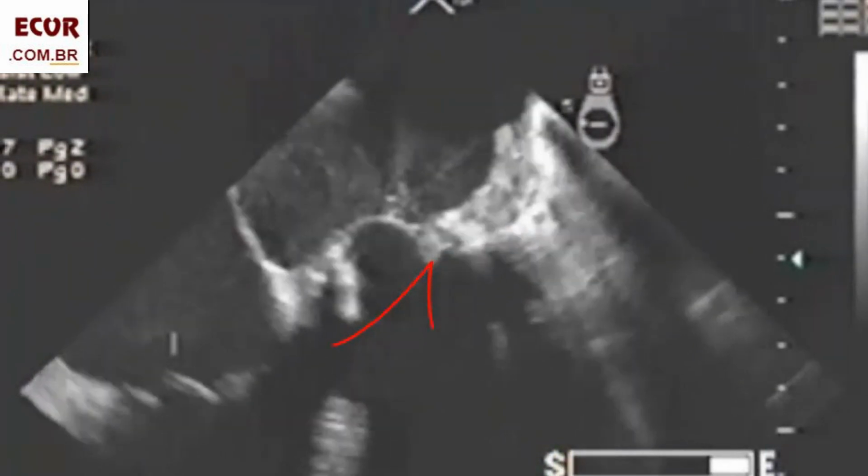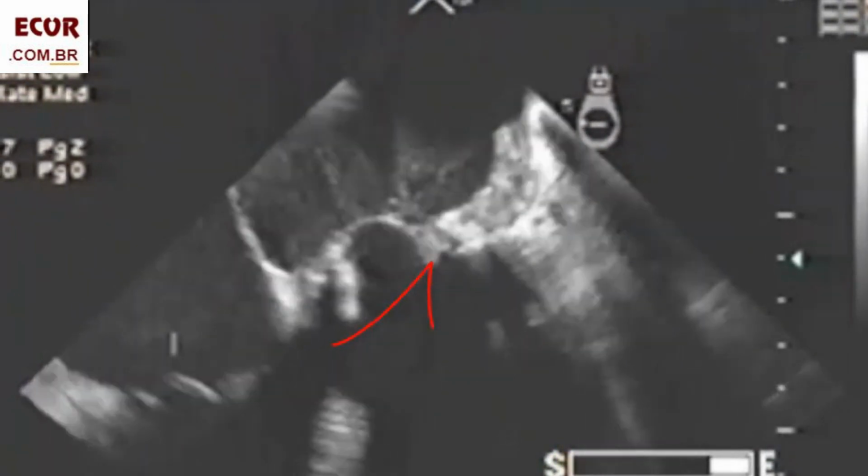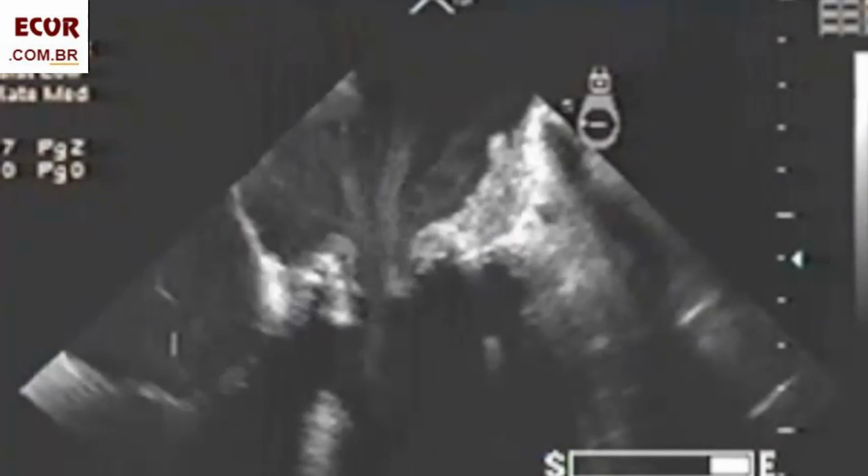It also affects the ventricular side of the leaflet, common with thrombus and unusual with pannus. By now, we can be almost certain it's a thrombus. Another TEE of a bioprosthesis with many thrombi, not only in the leaflets, but also on the left atrial walls. Watch its echo density, the same as the walls, then it certainly is a thrombus. It would never be a pannus with these characteristics.